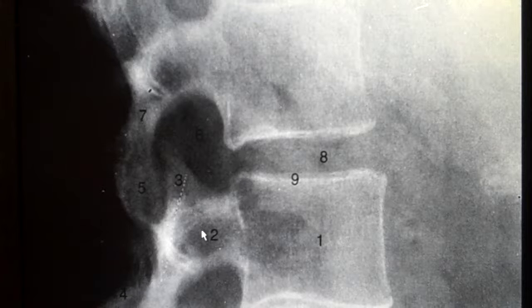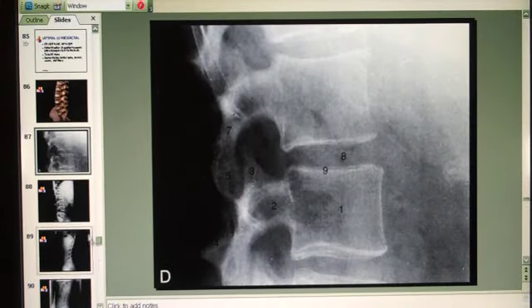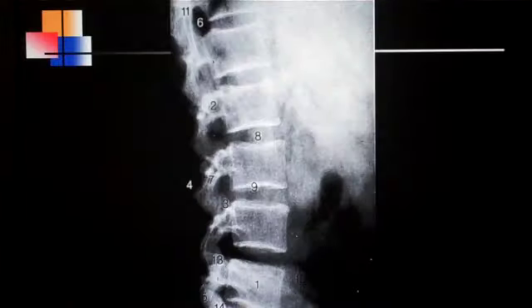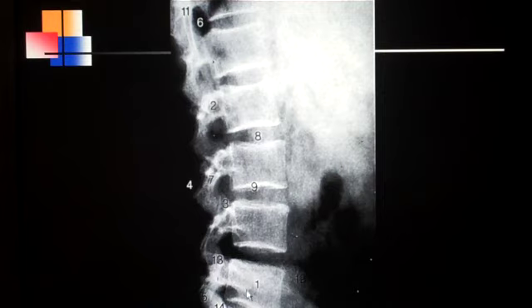I'm going to stay on the video and just go ahead and switch it to a lateral view, and keep the video running. Number 1 is going to be your vertebral body. Number 2 is up here on the pedicle. And if I stay on this segment, number 3 is on the superior articular process. And there's a superior here, there's a superior here. And so you see the joint space right there at the tip of the arrow. That is the apophyseal joint.